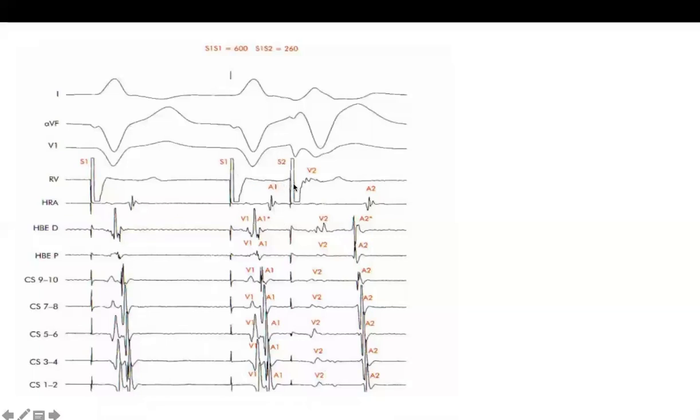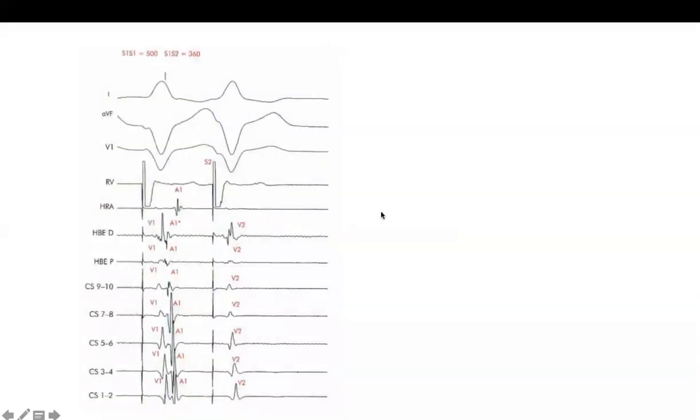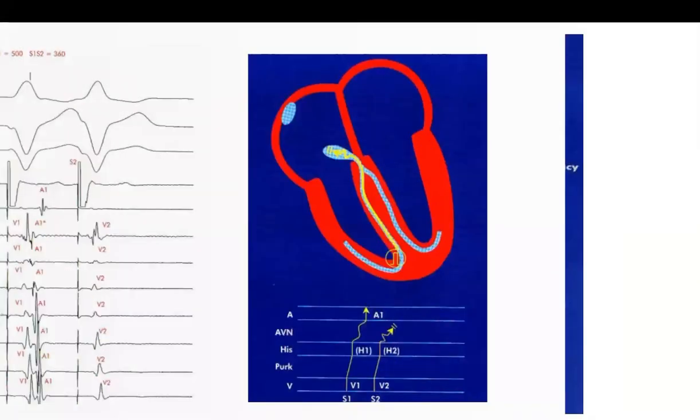When you shorten this duration, you get this atrial activity even later, until you cannot get retrograde activity because you shortened your VV interval so much. It depends on each patient, since they have different numbers, and then they might not tolerate it.